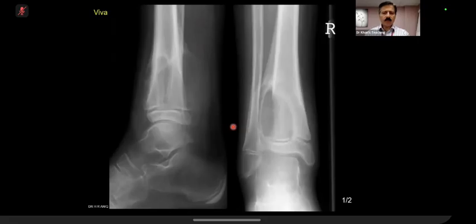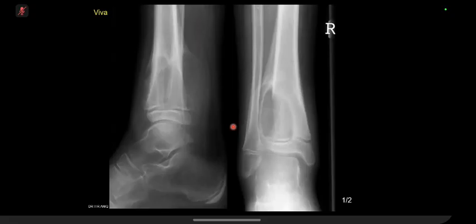Okay, I am happy with your thinking of an aggressive lesion, so I'm very happy with that. But why Ewing's and why lymphoma? It is a cystic lesion, isn't it? Yeah, just thinking, because it's quite aggressive, what aggressive lesions would I expect for someone that age. It isn't osteoid, which makes me think it's less likely to be an osteosarcoma.